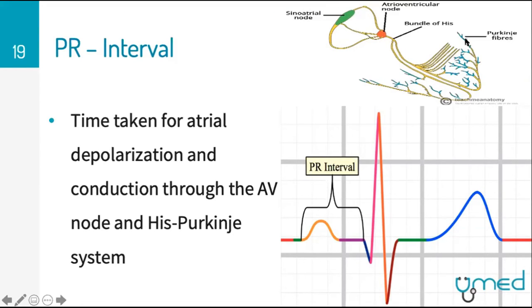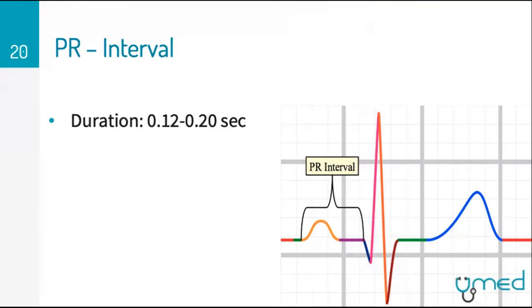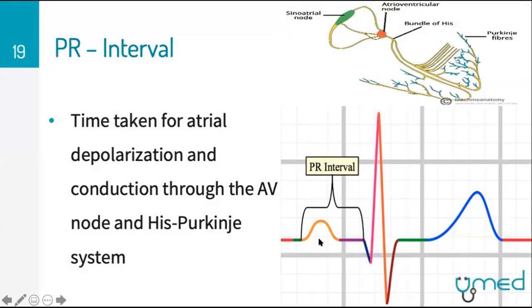Ensure that you know this. Ensure that you know what everything on this ECG plotting means and its correlation to the heart. Trust me, right? All right, cool. So to clarify, the PR interval is from the start of the atrial depolarization to when it reaches the end of the bundle branches. Yeah, when it reaches the end of the Purkinje fibers. Purkinje fibers, okay. Right.